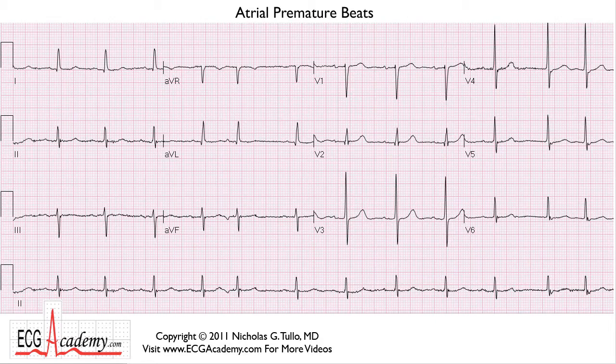Okay, well, here's the first tracing I want to show you. This is a real tracing. You can actually see there's real noise on this tracing. Remember, here in the ECG Academy, I'm making you ECG experts so you can look past the noise, can't you? These tracings are from real patients, not just drawings that you'll find in a textbook. All right, so let's look at the forest.